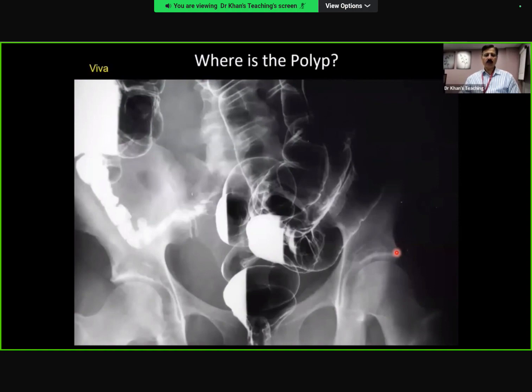Which position has the film been taken in? This is a viva question. Candidate 1. It's frontal. So what is the position of the patient? It's oblique, fronto-oblique, or lateral. Lateral. You see, position. I'm asking you the position of the patient. So you are right that this is an AP film, but the position of the patient, if you see, these are air fluid levels. Erect.